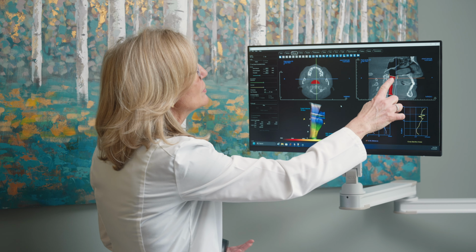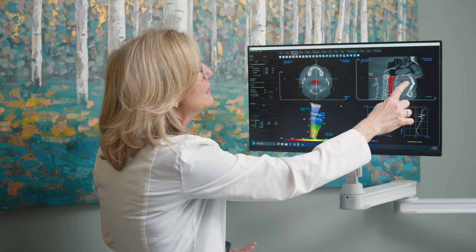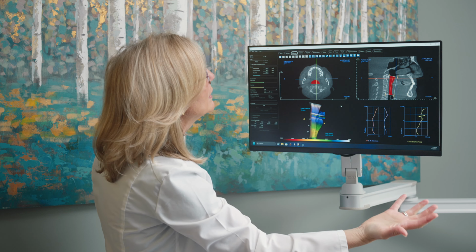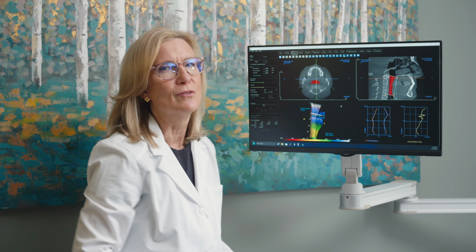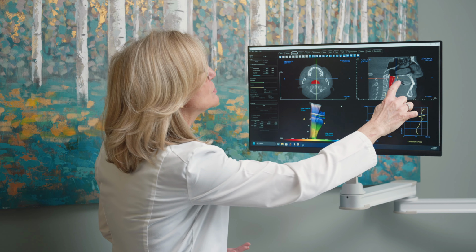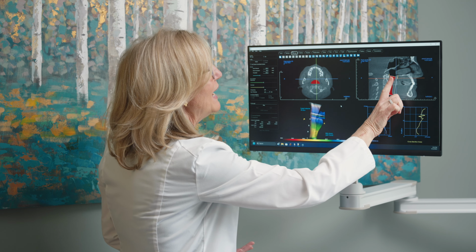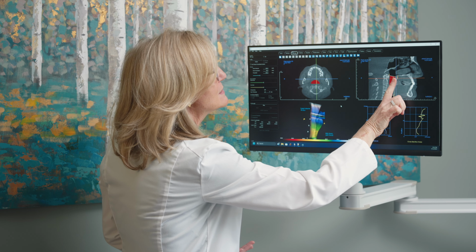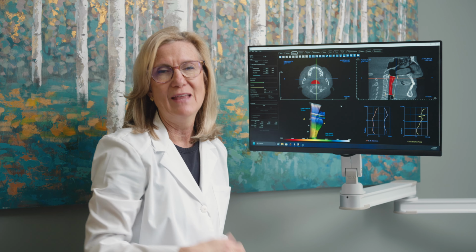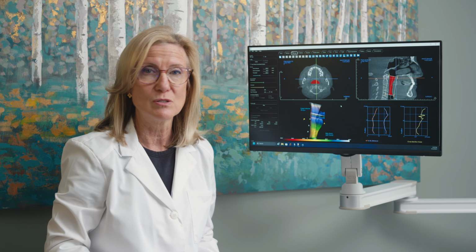So something else to notice, here's a side view of it. There's the size of my airway. This is my tongue on the roof of my mouth. You say, well, where is the tongue? Where's the roof of my mouth? Exactly. They're one. So the tongue is all the way up here on my palate. When that happens, it brings this whole part of my tongue out of my throat, and that's how I can breathe well with my nose and get oxygen down to my lungs.